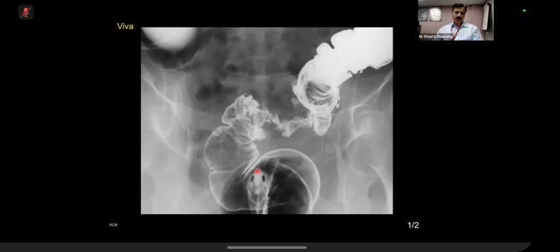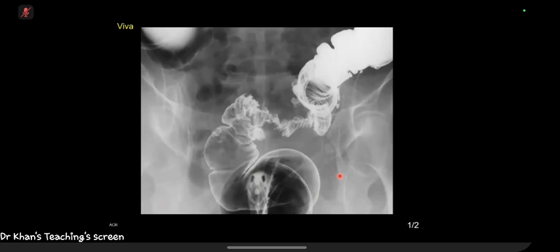Yes, please. What's happening here? So it's a sigmoid colon with quite marked stricture, with a bit of ulceration as well. Or yeah, there's an apple core kind of stricture. I cannot see the shoulder though. I cannot see the rest of the bowel. Visualized descending colon appears normal. So there's abnormality centered at the sigmoid colon, with the very thin, string-like stricture.